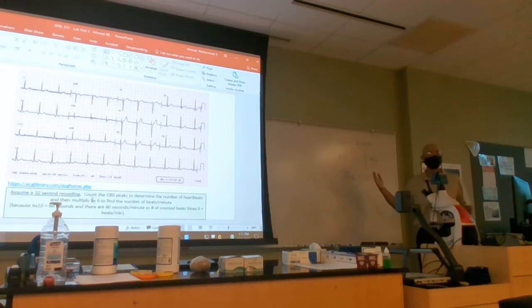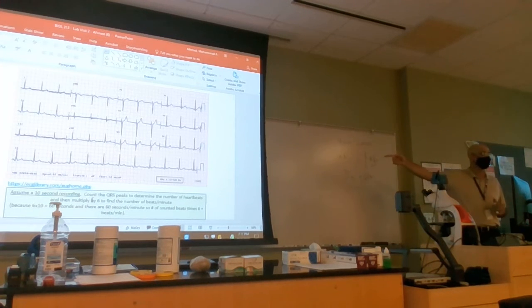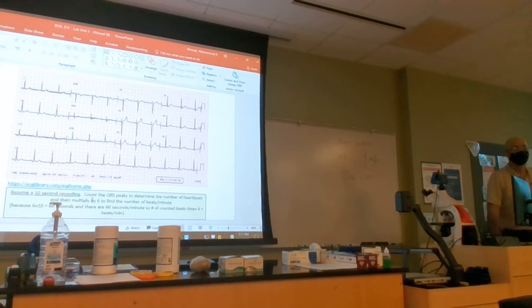And so the second question will be, this recording was done after exercise or before exercise? Before, right, guys? When the person was resting. Let's say if you have a heartbeat over 100, then you would say what? This tracing was the person after he exercised or she exercised.